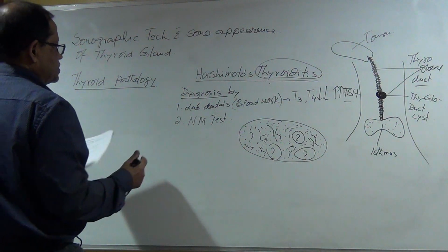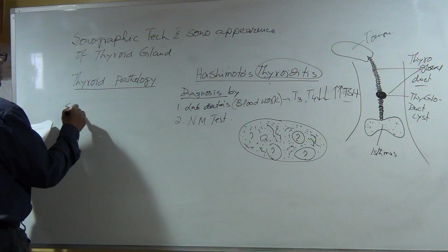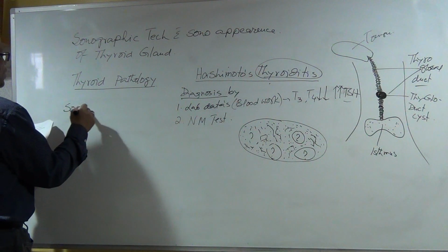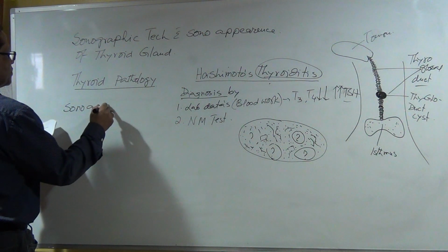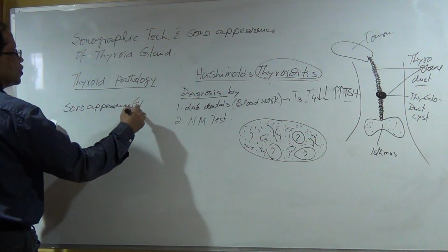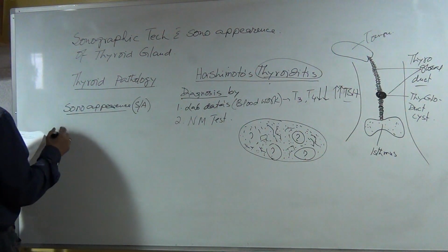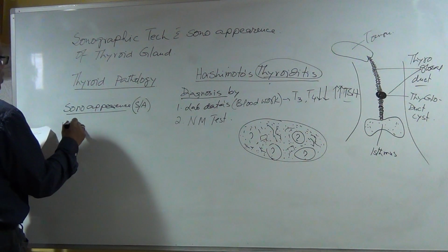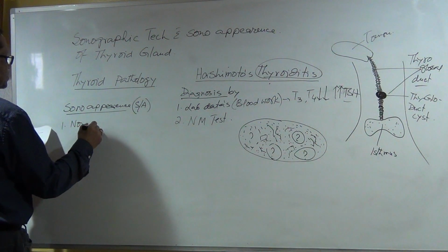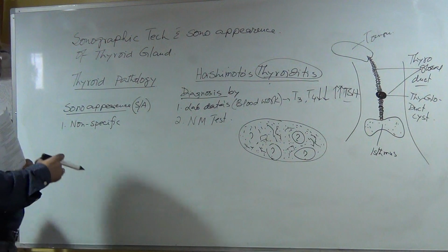Sonographic appearance, or sono appearance, is non-specific.